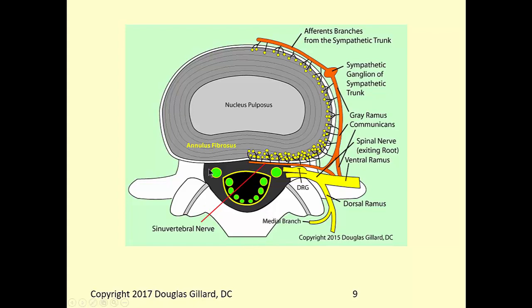Okay, and this hole is the vertebral canal with the, what's this thing? It's not the spinal cord. That's the thecal sac. Thecal sac. The thecal sac goes all the way up to the occiput, the foramen magnum, but it's very narrow in the cervical and thoracic spine. It's huge in the lumbar spine.